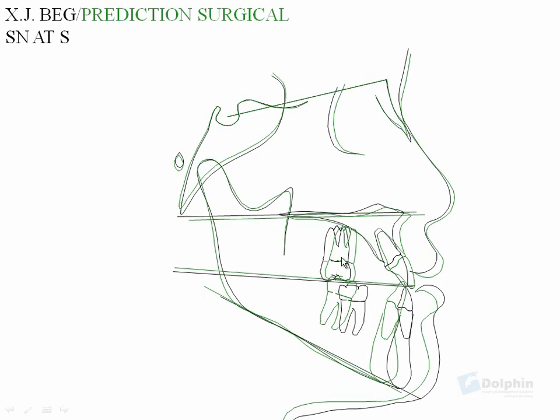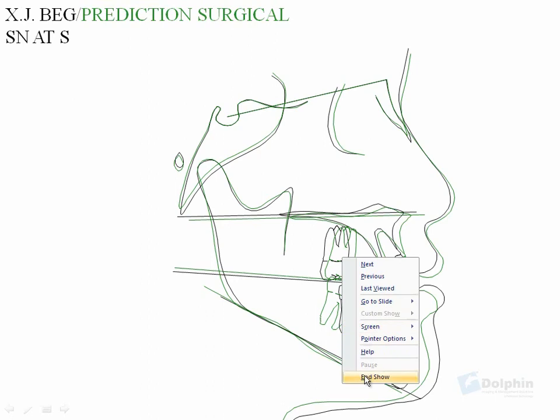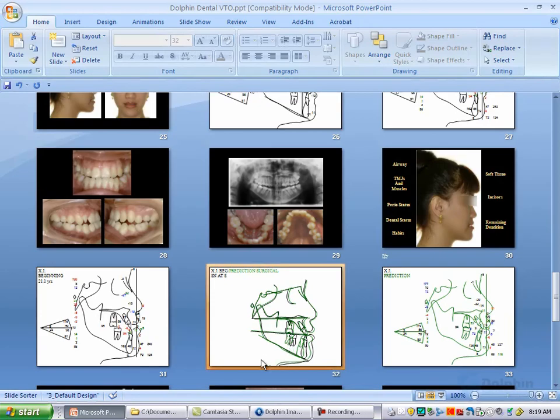All right, now let's leave the PowerPoint and return to our Dolphin main screen.